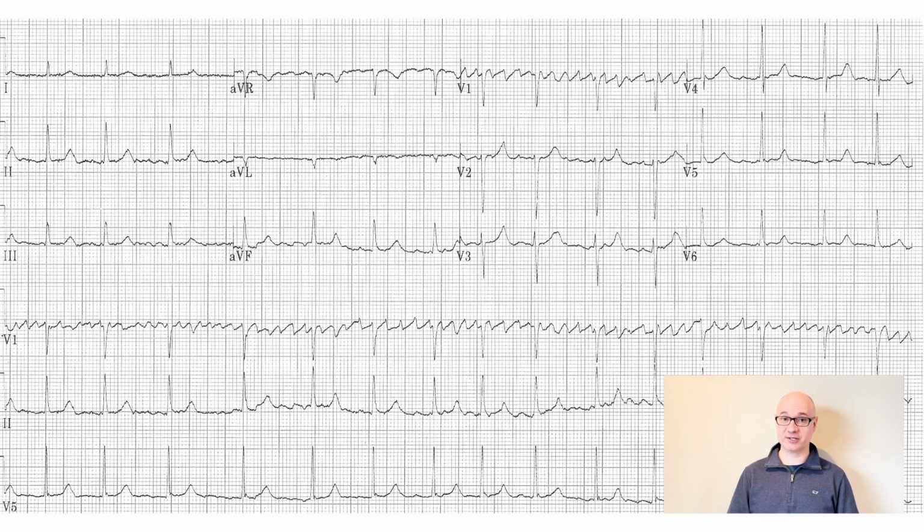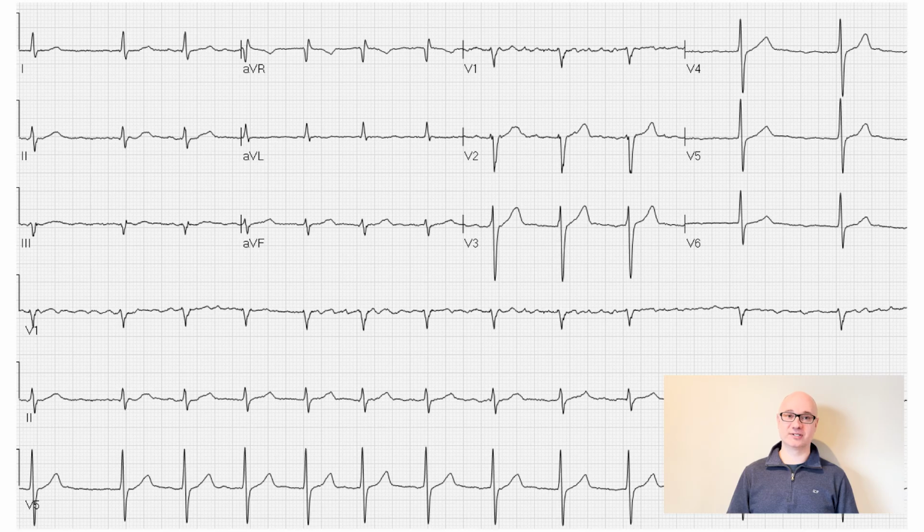In example 1 here, you can see an example of coarse atrial fibrillation in which the baseline is very choppy, and that signals that usually this is pretty new atrial fibrillation where the voltages in the atria are still pretty good. And then in example 2, you can see fine atrial fibrillation, where the atria have had atrial fibrillation for a long time, so the voltages are very low, and you can hardly see any deflection from baseline.